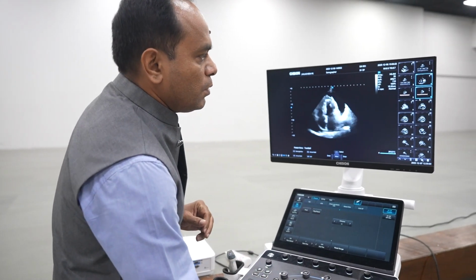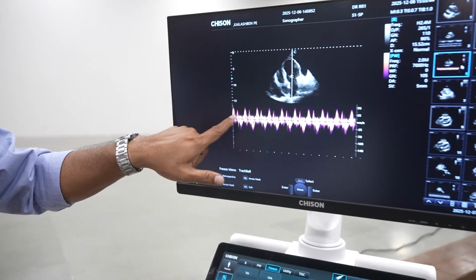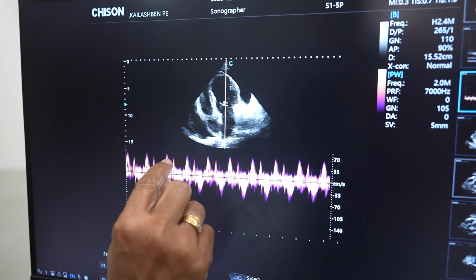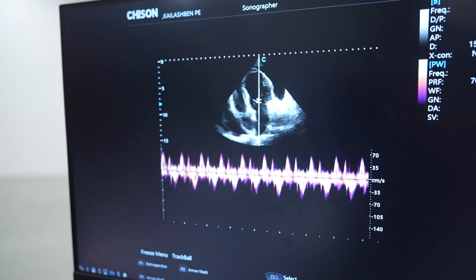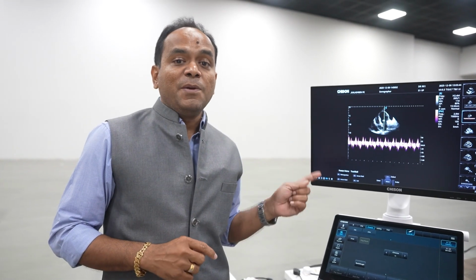If I show you the mitral inflow pattern, there is a variation in the mitral inflow in cases of pericardial tamponade, meaning some of the mitral waves will be small and some of the mitral waves will be very large depending upon which phase of respiration that is. Here it is absent in our patient. Had that been present, it again qualifies the patient for cardiac tamponade.